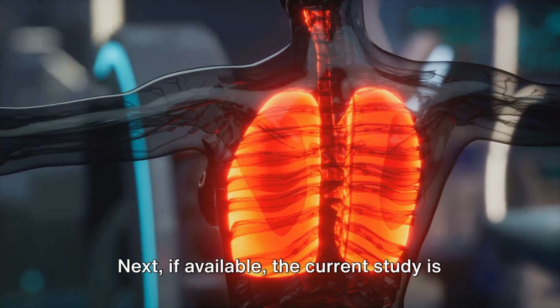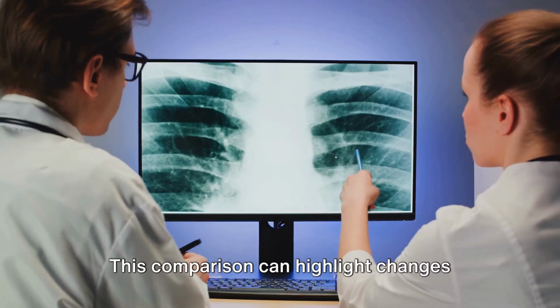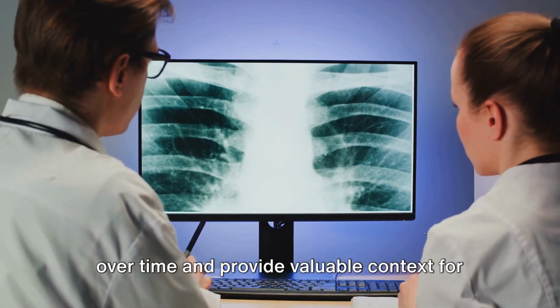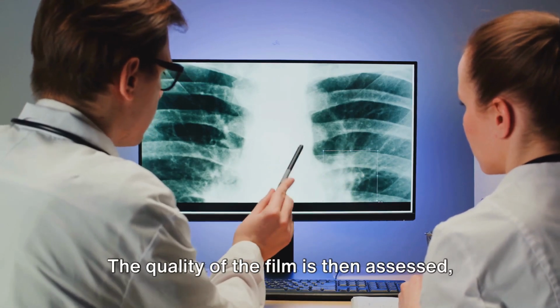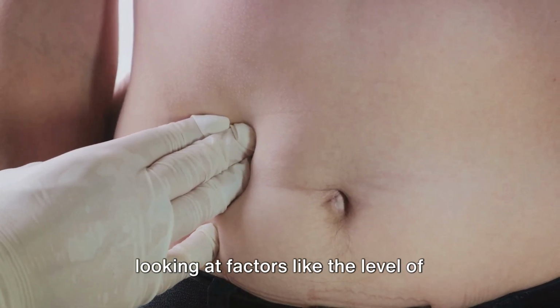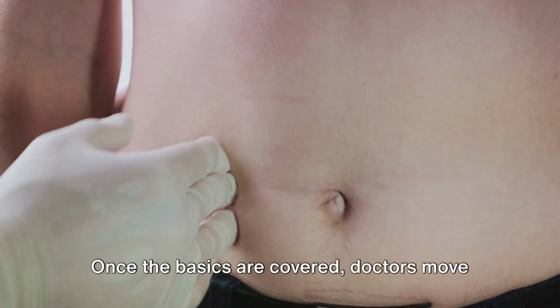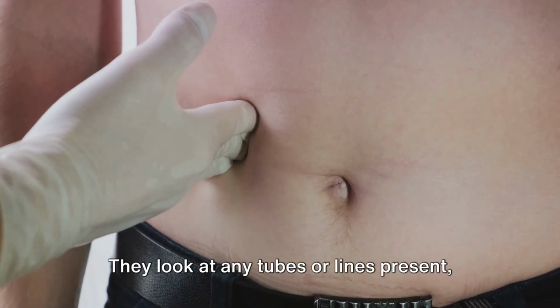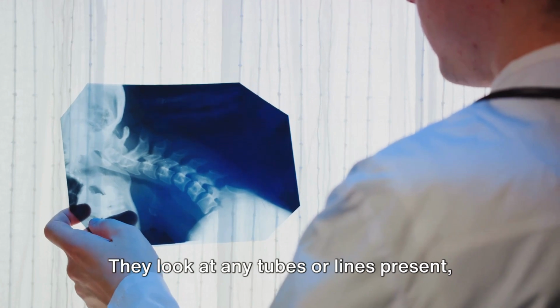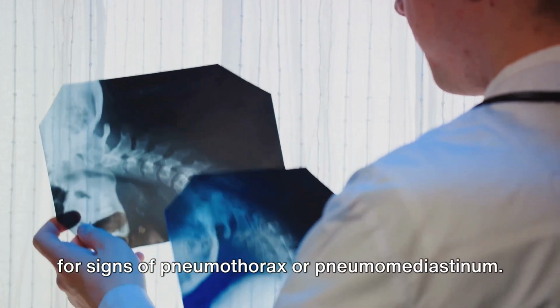Next, if available, the current study is compared with previous X-rays. This comparison can highlight changes over time and provide valuable context for the current findings. The quality of the film is then assessed, looking at factors like the level of inspiration, penetration, and rotation. Once the basics are covered, doctors move on to the analysis. They look at any tubes or lines present, checking their position and being alert for signs of pneumothorax or pneumomediastinum.